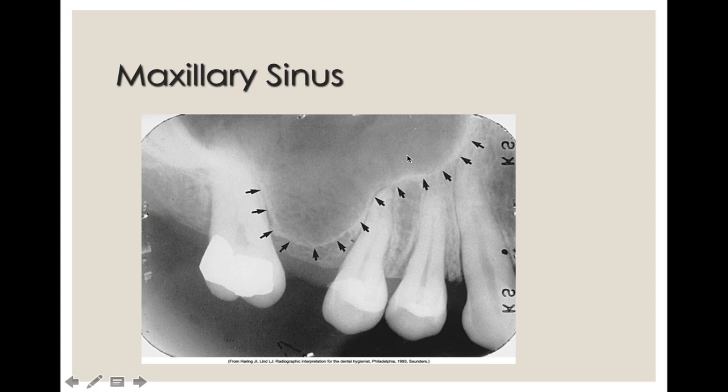Again, a very important one, not only for interpretation, knowing if you're on the maxilla or mandible, but also in private practice or looking at radiographs, because obviously if the sinus is closer to the teeth, we're going to be looking at a few different problems.